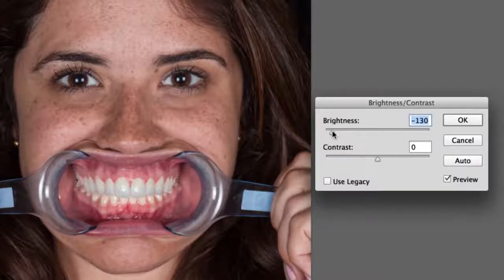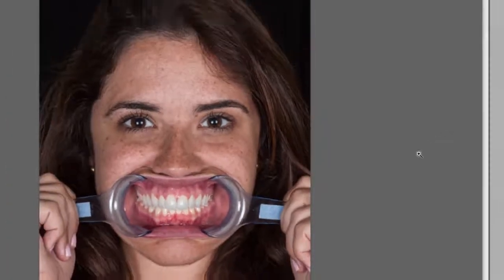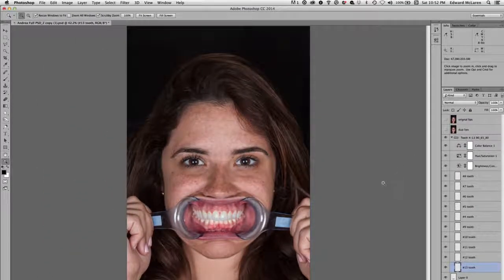And then I can turn this tooth black back there if I wanted to. Tooth number 13, is it? Yeah, there we go. It's black. Well, I don't really want it black, but maybe I thought it was just a little bit too bright. I didn't think I could create that. I could darken that individually. So these are all little individual tweaks you can do. And I can show, again, lips on, lips off. So that's how I would do individual adjustments of color. I could do it as a group, color balance, like I just showed you, or I can do it individually through the image adjustment menu.